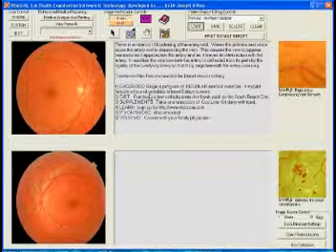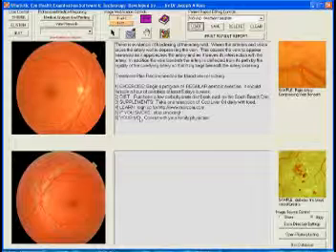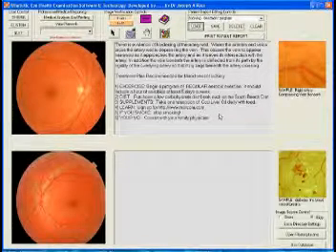The text here tells you what's wrong, what we found, and down here it tells them things to do. It gives them a starting program. It talks about exercise, diet, supplements, learn by going online, and I give them a hyperlink. If you smoke, stop smoking, and consult with your medical doctor. I'll also send the medical doctor a report, so when they come, the doctor will know why they're coming.